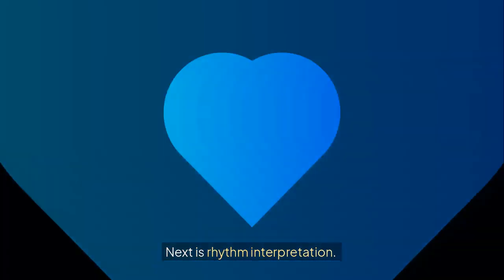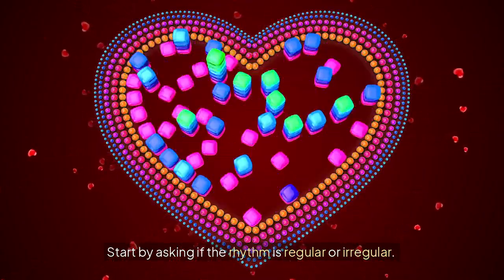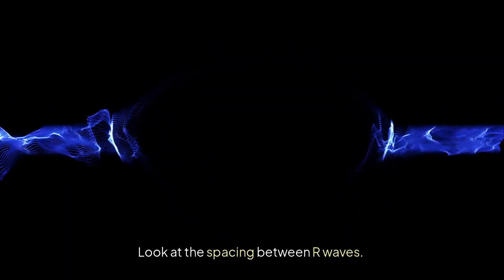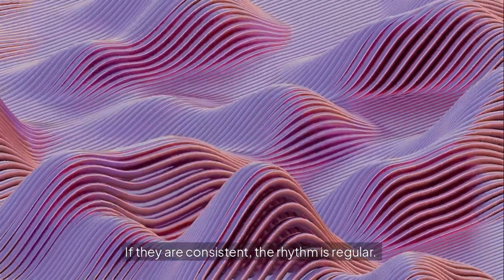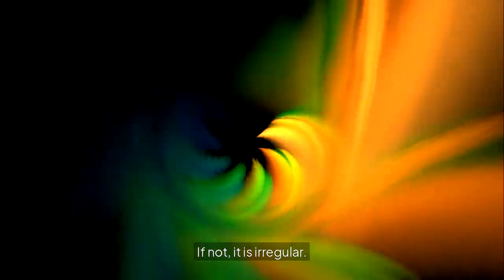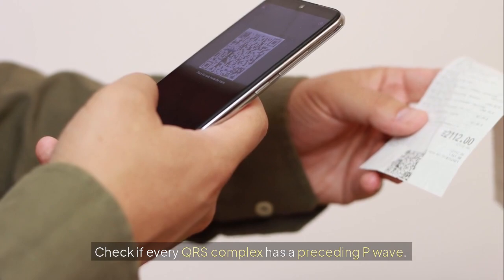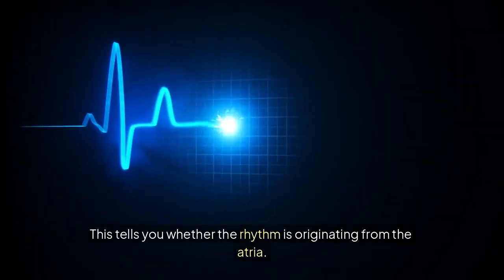Next is rhythm interpretation. Start by asking if the rhythm is regular or irregular. Look at the spacing between R waves. If they are consistent, the rhythm is regular. If not, it is irregular. Check if every QRS complex has a preceding P wave. This tells you whether the rhythm is originating from the atria.